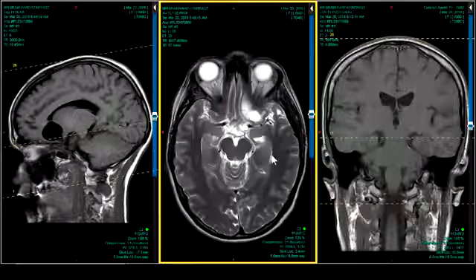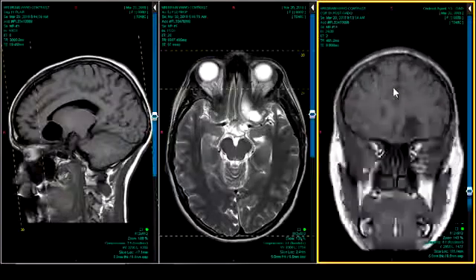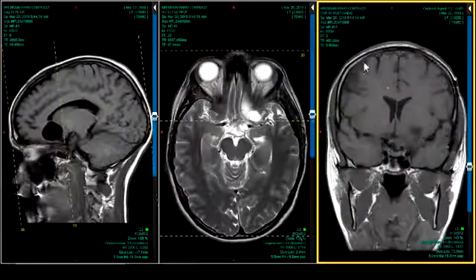Cystic mass with a mural nodule. So you're used to seeing that in the posterior fossa. This is a young person. But here we've got one with unusual anatomy, but you can fit it into that pattern if you're wondering about what's going on with this. Do we have the post? I believe we do have a post. Yeah, here it comes.